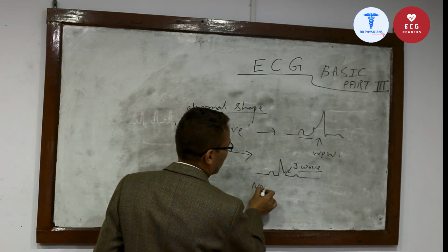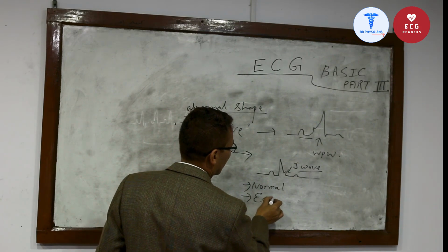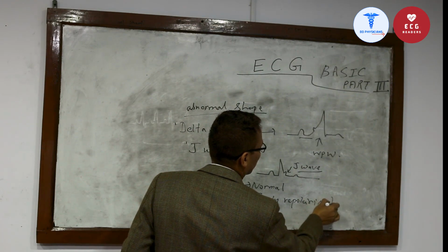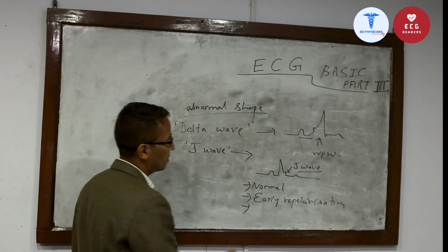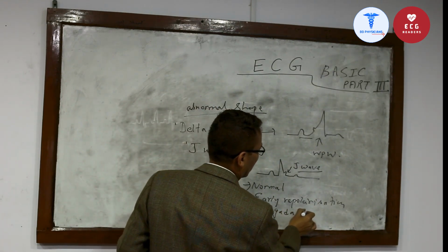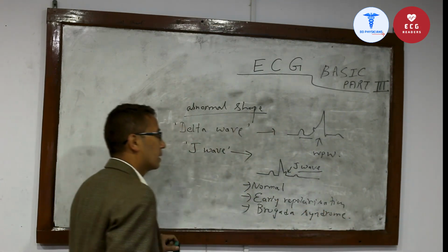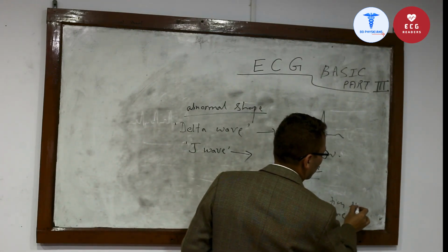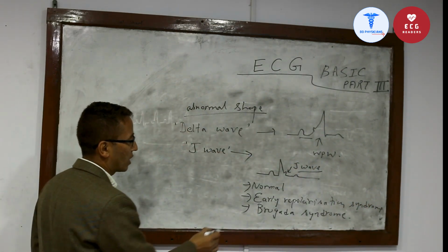It may occur in a normal person, in early repolarization syndrome, in Brugada syndrome, and it may occur in hypothermia.